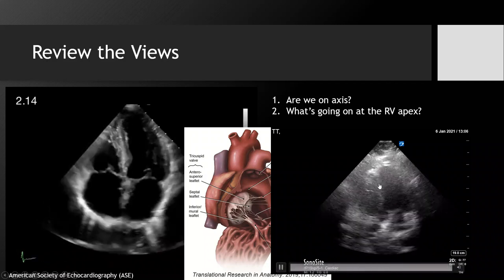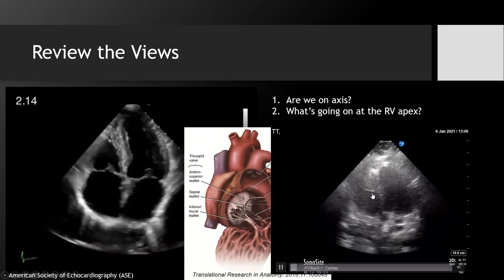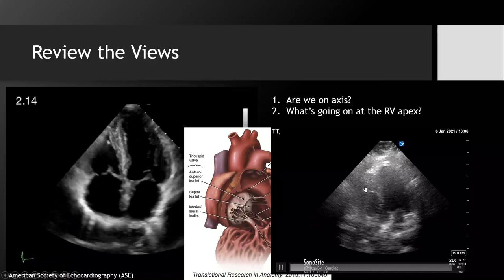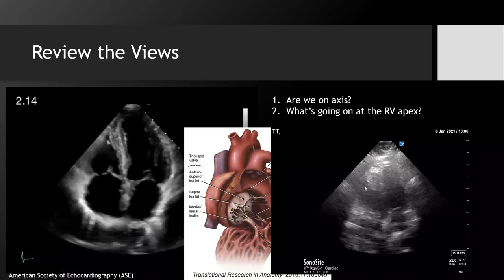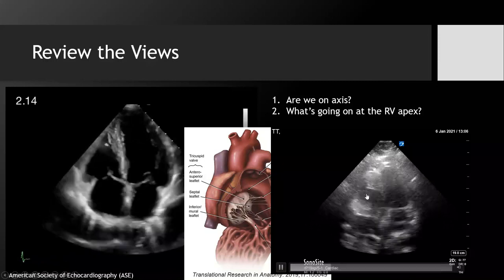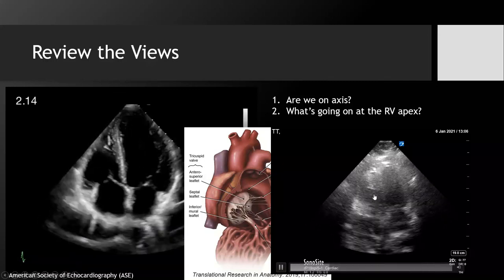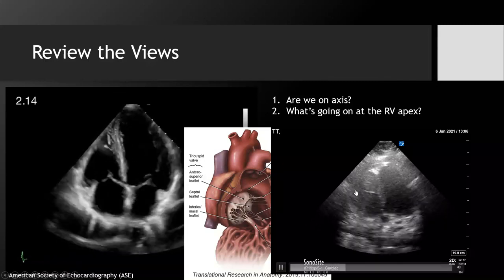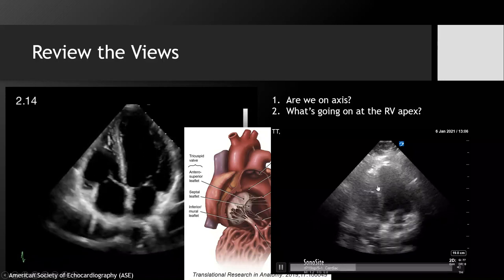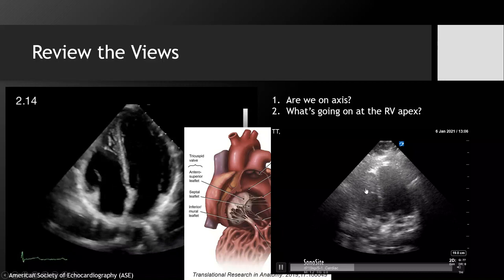It's really good that I started learning critical care echocardiography. And then you get a formal echo and they see this and they say, well, this is not an RV thrombus at all. And you begin to realize that this is really just some artifact reflections off of the moderator band. And it's actually quite a common thing to see. So something to look out for, to be wary of before overcalling.